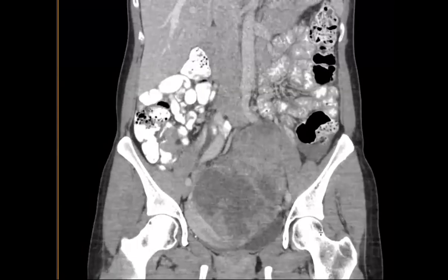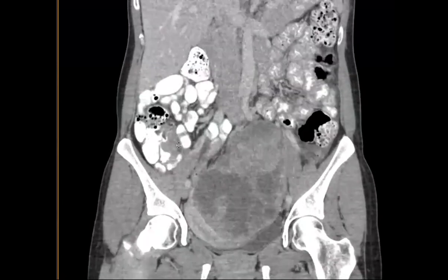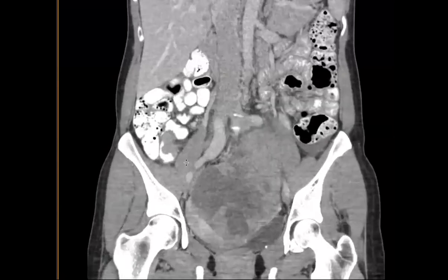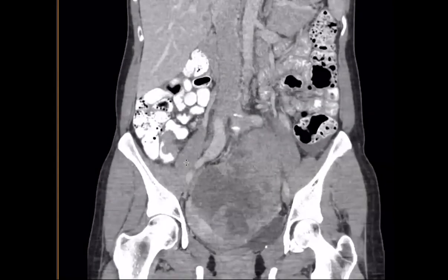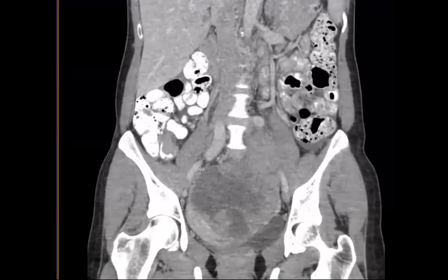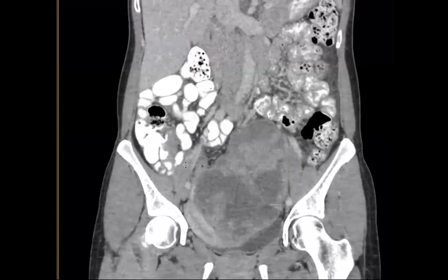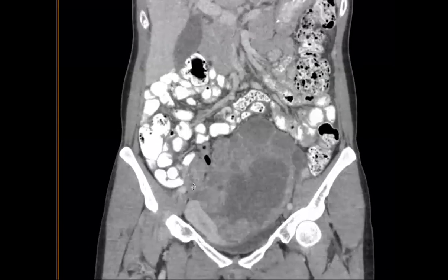The other thing I read is that if you have a colonic mass and ovarian masses, it's more likely a colonic cancer with ovarian mets than ovarian cancer with a colonic met. Agreed. And if it's the appendix, sometimes the appendix can be really hidden because the ovarian mets are so large that the appendicular primary can be completely hidden, and it may be difficult to find prospectively as well.